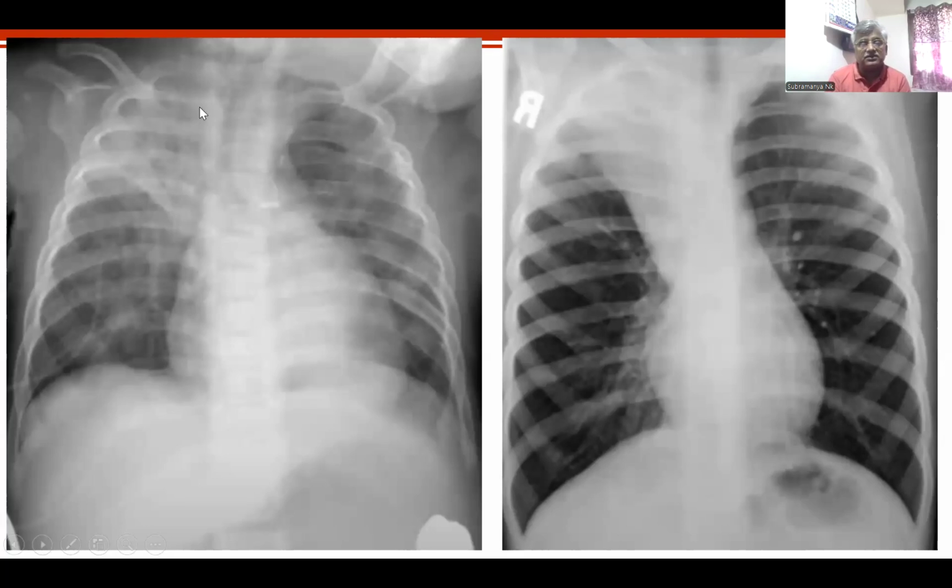Can you understand heterogeneous opacification of the right upper lobe? Not much of compensatory hyperinflation. Here there is no question of hyperinflation. This is a mass. This is not even a collapse. I don't know how you could differentiate between a neuroblastoma and atelectasis. This requires a little bit more expertise or reading. This is where you would need a radiologist.